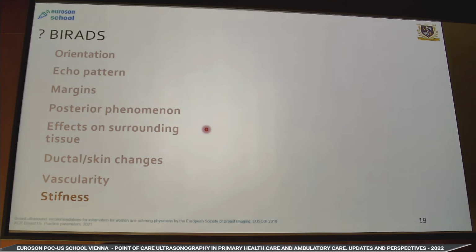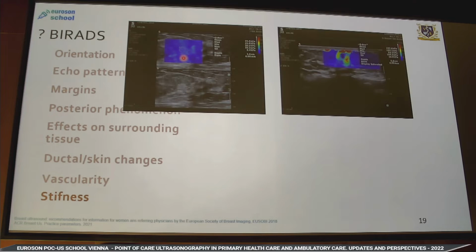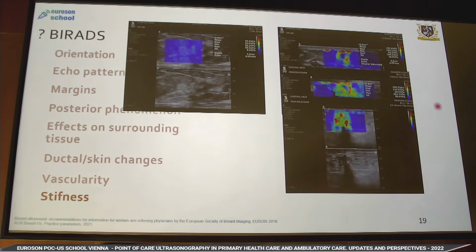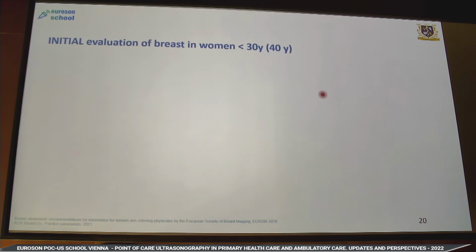And just a quick remark about elastography, since we will have a special elastography talk today. So whenever you see a soft lesion, it re-emphasizes the benignity of your lesion, and the rate of mistake is below 3%. And whenever you see stiffness in the tumor or in the surrounding 3 to 4 millimeters of the tumor, regardless, all these images are already high risk, and I really did not want to go further into a threshold and so on.